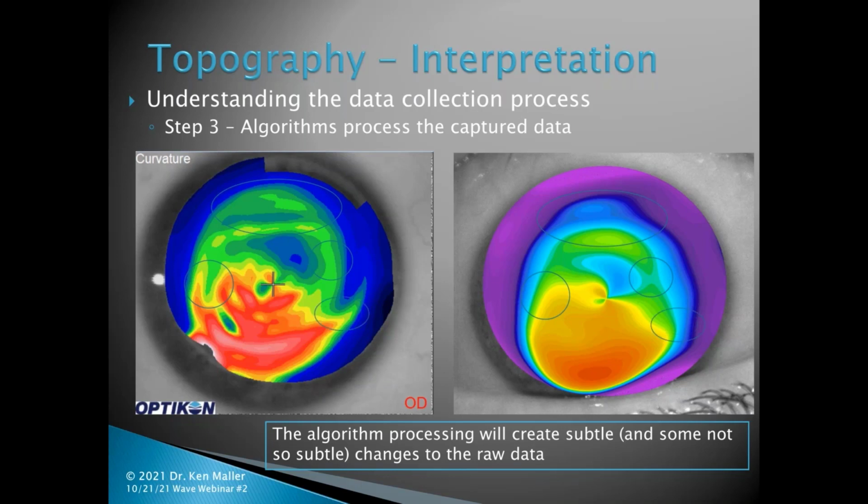Down over here, once again, we have that sort of downward-shaped triangular flattened area that doesn't seem to be present on the pentacam. And most interestingly, you can see that the steepest portion, or the most curved portion, on the scout is a bit higher up on the image than it is on the pentacam, as well as the overall shape is considerably different. So these changes really can make a difference in how Wave is going to use the template to then design up a lens. And this can be feeding you data that alters your thought process to design possibly error into your lens design.